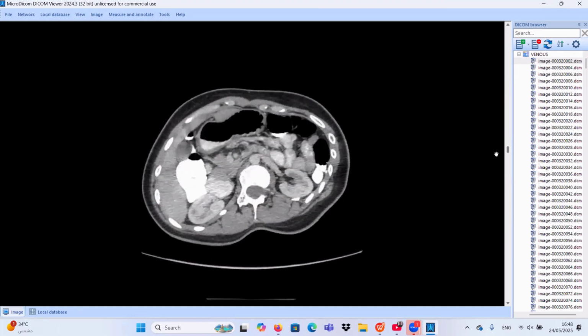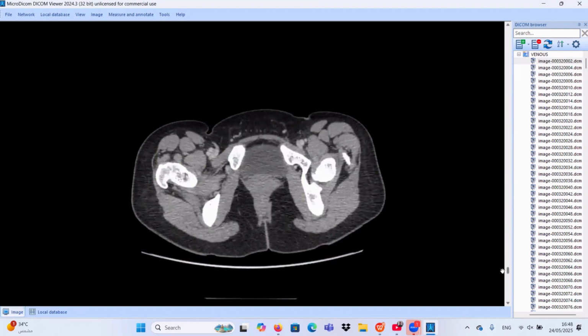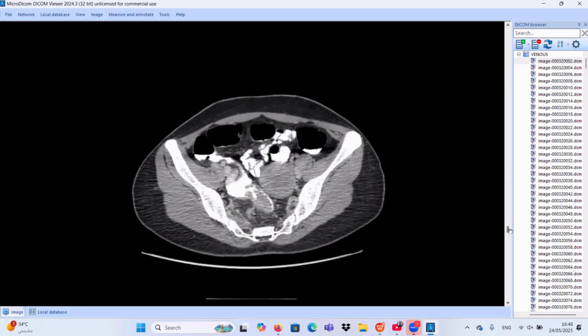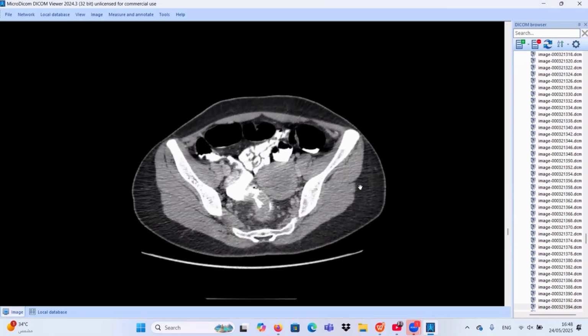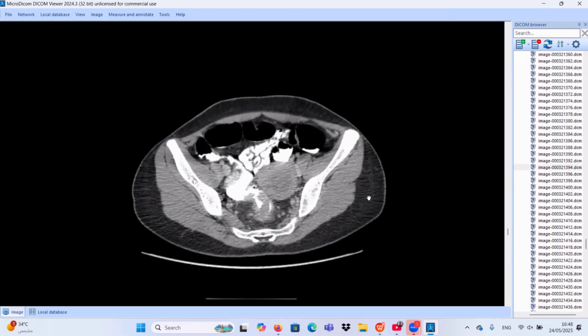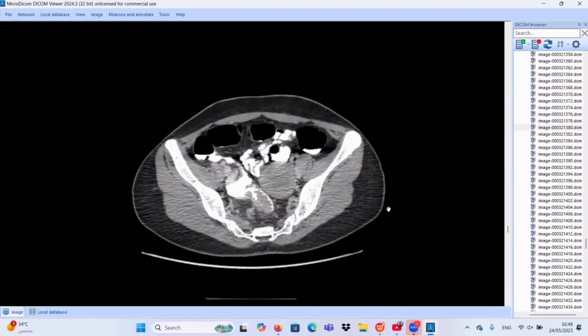This is a CT scan for the same patient. I agree with you, Doctor. Okay. There is a rectosigmoid mural thickening, irregular mural thickening. Very nice. Yes, you are right. It is circumferential with irregular mural thickening showing enhancement of the wall and narrowing of the lumen. Yes, with some sort of shouldering at both ends, and some sort of smudging of the surrounding fat with nodularity. Okay. And also I think we have paracolic lymph nodes.